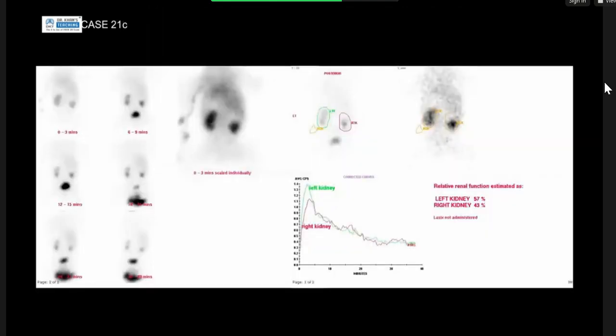So because we've got an obstructing ureterocele, the patient's gone on to have a MAG3 study, which is another nuclear medicine study. But this is with the isotope taken up by the kidneys and the proximal renal tubules, if I remember correctly, and then it's excreted. So this is a functional assessment of the drainage of the kidneys. So are you able to look at this, candidate 3?